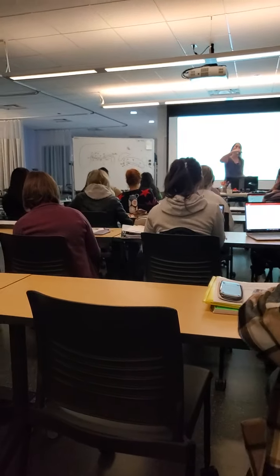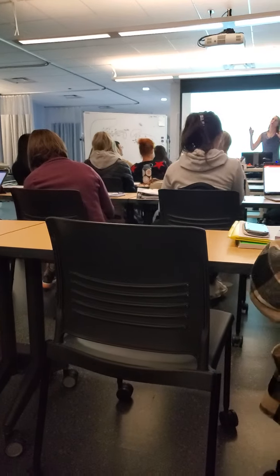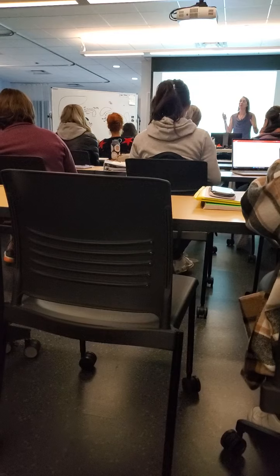Okay, so we had our head and uncinate, wrapping around that main portal vein. And then we have our neck, body, and tail. Tails are notoriously difficult to see and to clear out because they drop so retroperitoneally. So there's a whole box on my worksheets at work that says tail not seen. It's just so common that it's a whole check box.